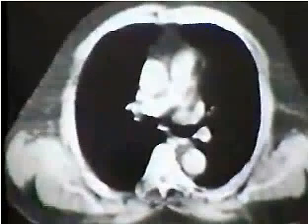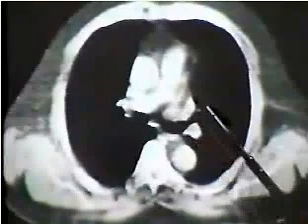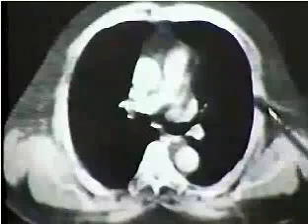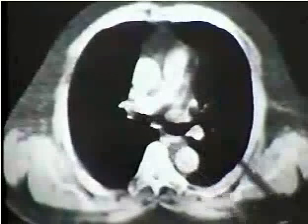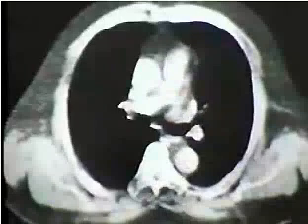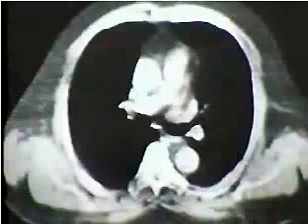Here's a CT scan at a very comparable level. A dense, contrast-filled shadow in front of the bronchus is the left upper lobe pulmonary vein, a little bit of the left atrial appendage here, the right pulmonary artery crossing the mediastinum, the ascending aorta. Look at the superior vena cava. It's all squashed in here. It's a very compressible structure, isn't it?